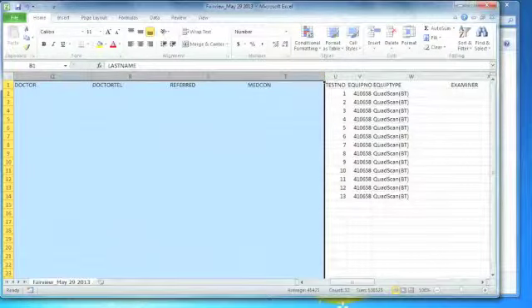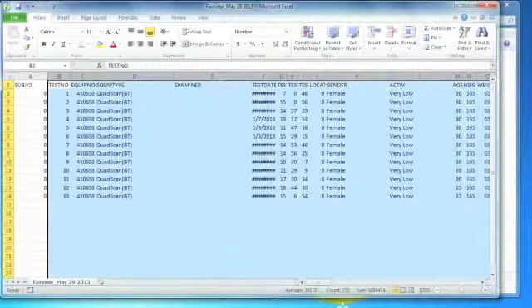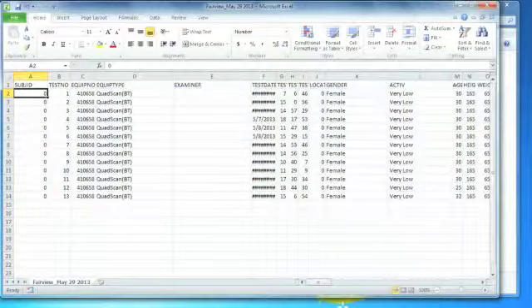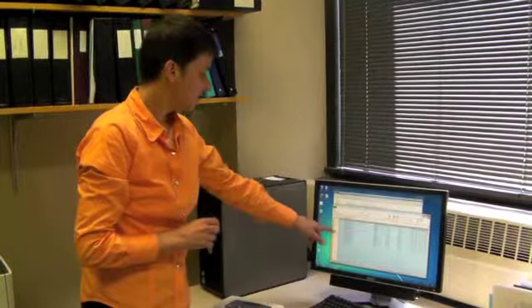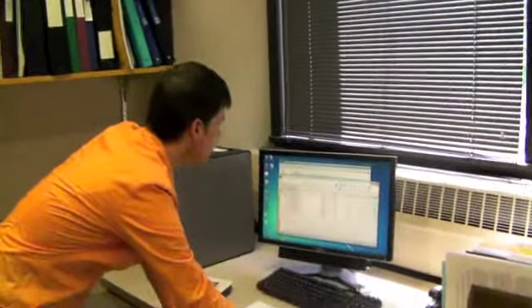So I've highlighted columns B through T, and now I'm just right-clicking in that space there so I can delete those. And now you can see that there's a subject ID column labeled under A and test number. And so remember that every time I have you do a test, I'm having you write down that unique test number that corresponds to the data for that particular subject. And so these test numbers, they don't mean anything without tying them to a study subject ID number. So the specific defining number for your subject, for your site and for the study, needs to be entered in.